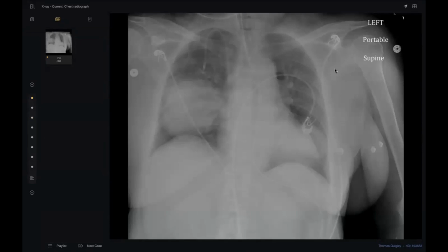Yes, sir. Welcome. Another case. Okay, now history. This patient has dyspnea. Okay, so I'm presented with a frontal chest radiograph of an adult patient who presented with dyspnea. I can see that there is a large opacity projected over the right lung, middle and lower zones. It appears lobulated, well demarcated, no other focal lesion. What's your differential for this?